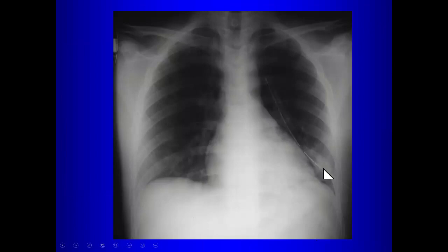What is this thing here? Chest tube. That's a chest tube. So notice this white line in the chest tube, but there's a break in the line right here. Why is that there? What does this tell you? That it's not draining fluid? Well, it's not why the break is there. Why is the break here? What is that there for? There are many holes in the chest tube. This is the hole closest to the outside. So you want this inside of the rib cage, you want this in the pleural space.